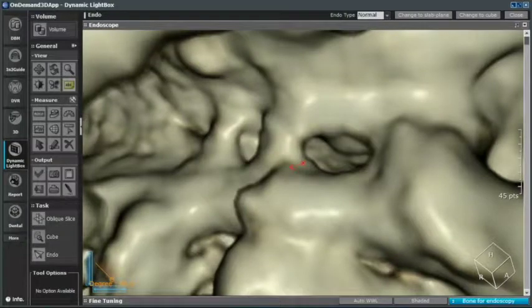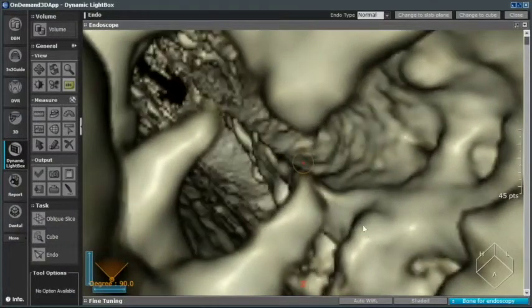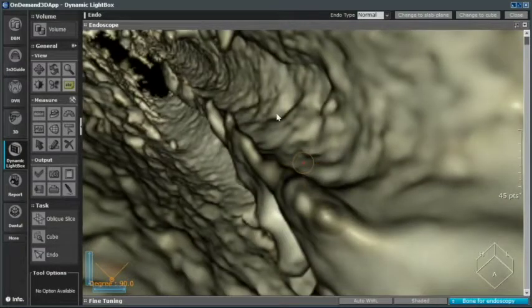First of all, I'm trying to find the canal, which I think is over here. There we go. I'm going, the inferior alveolar nerve canal's in there, okay? We're going down, that's it, right there.